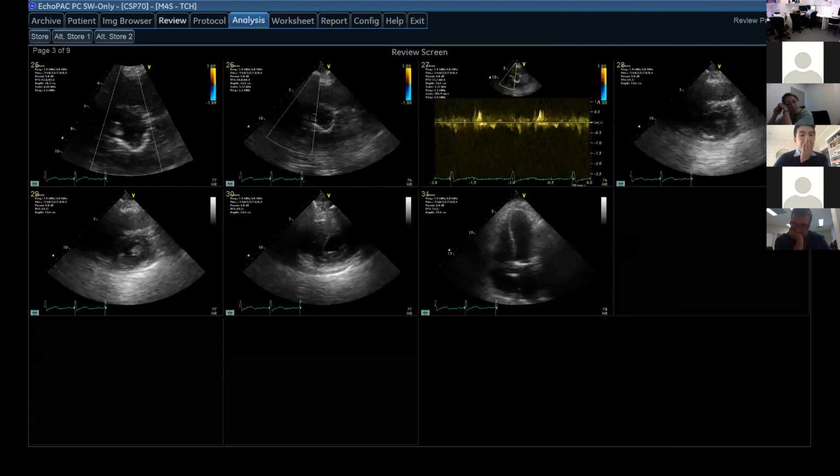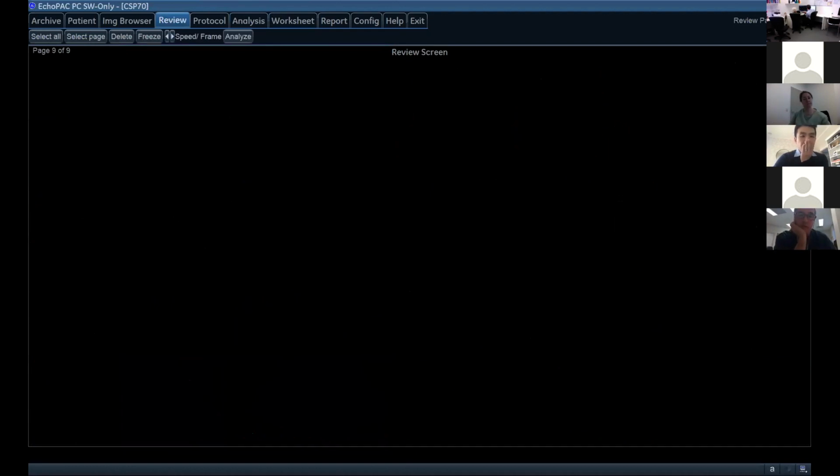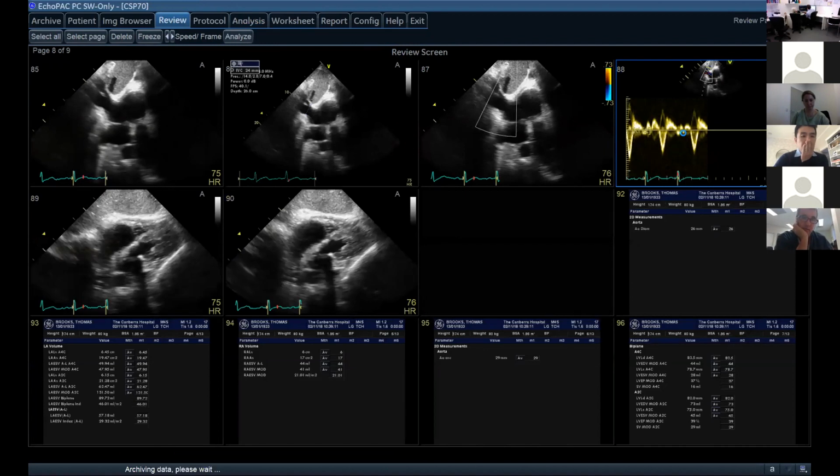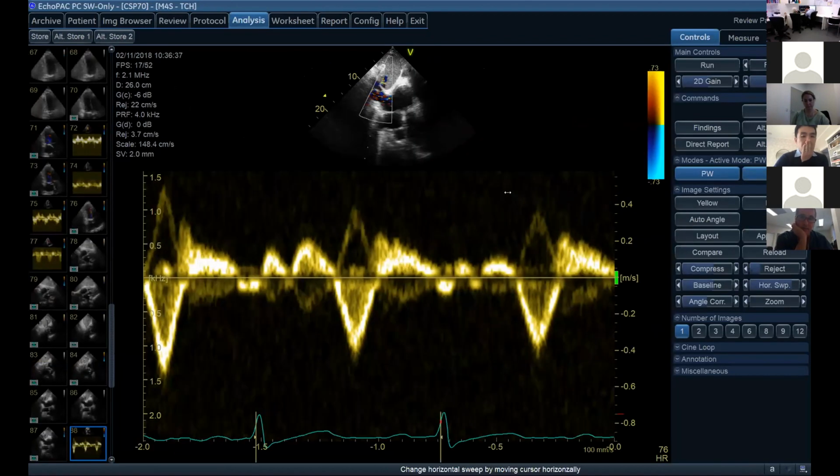The one last thing that you can look at, which is great for the exams as well: hepatic vein diastolic reversal is greater than expected. During what phase of the cardiac cycle? During the expiration phase. Great work. So here you can look at the flow in the hepatic veins, ideally with the respiratory cycle, but you're looking at diastolic flow reversal that is worse during expiration.